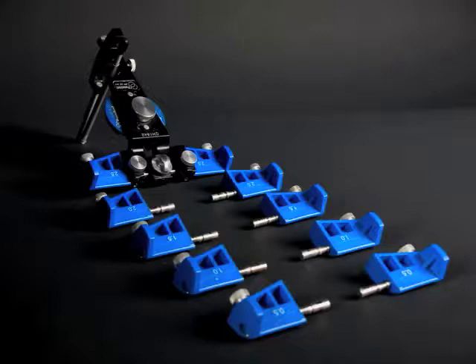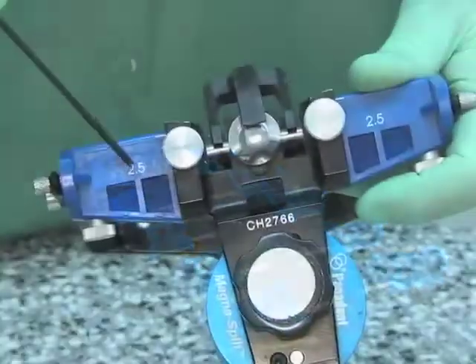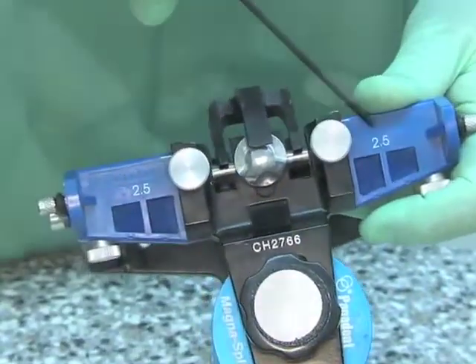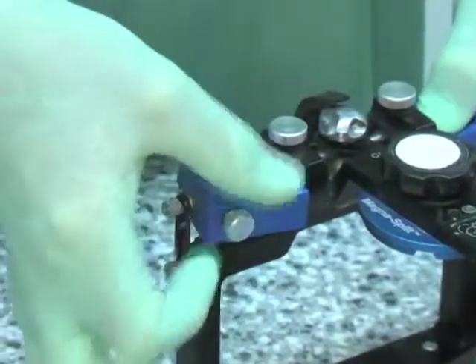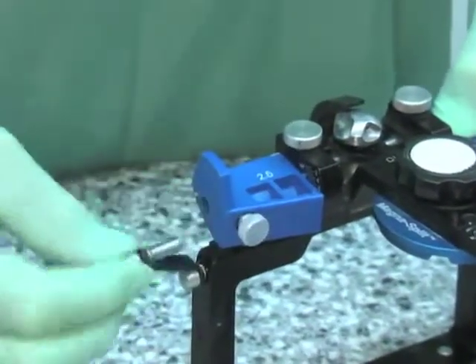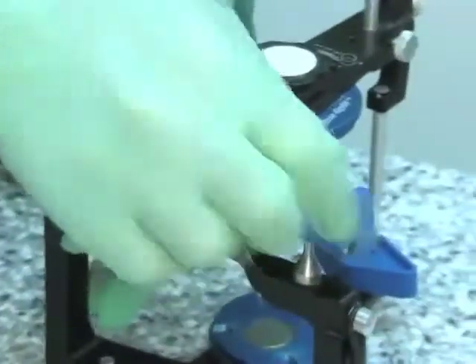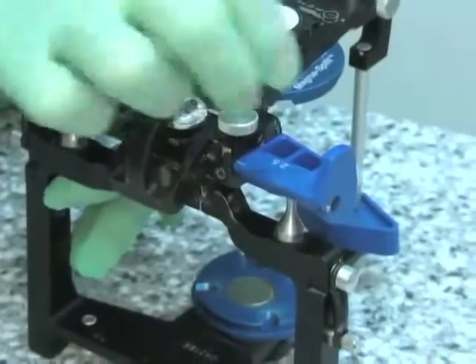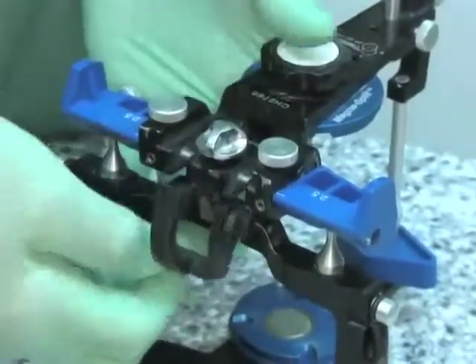The Panadent Corporation manufactures generic motion analogs for its articulator in half-millimeter increments from 0.5 to 2.5. Recall in doing the hinge axis location, the Bennett shift was established for the patient. Here the viewer can see 2.5 millimeter analogs already in place. Remember, the patient had Bennett shift recordings of 2.5 on the left and 1.5 on the right.